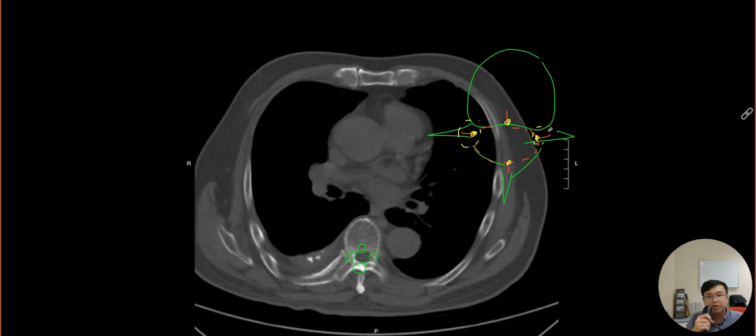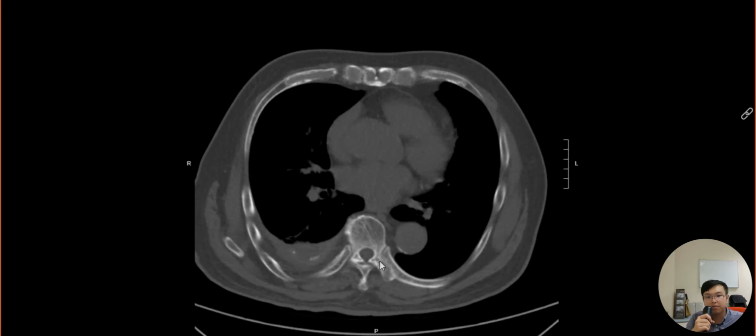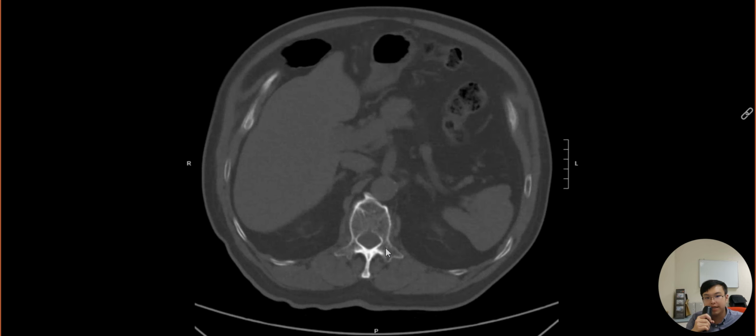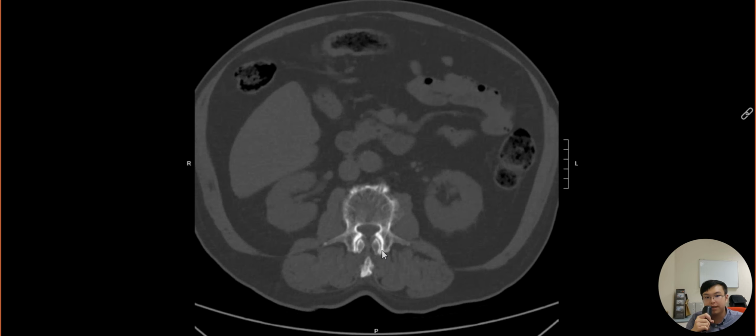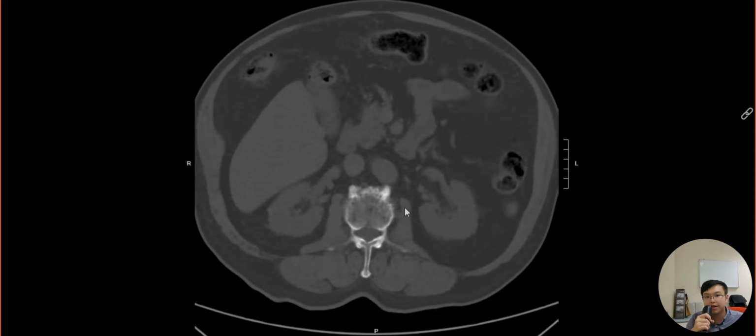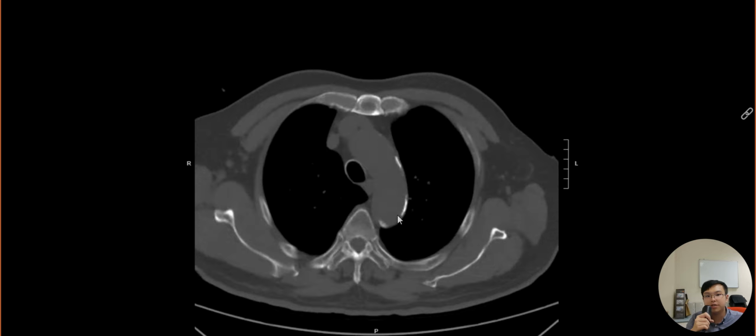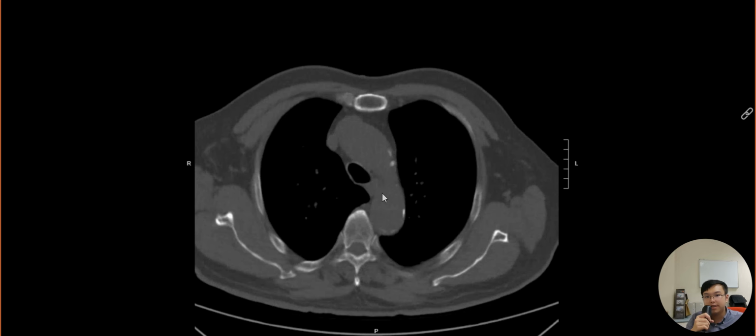That is why it is famous to look for any bony erosion of the pedicles on radiograph to suggest hematogenous metastasis. But in fact, the posterior aspect of the vertebral body as well as the spinous process are also very classical. So we need to pay extra attention when we scroll through the spine slowly, to see any bony erosion or bony lesion in those areas, which is quite suggestive of metastasis. However, we do not see any feature to suggest so in this CT.